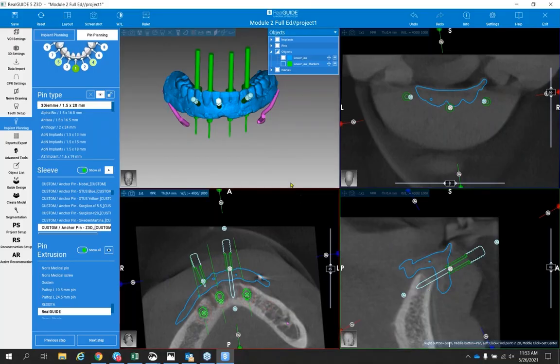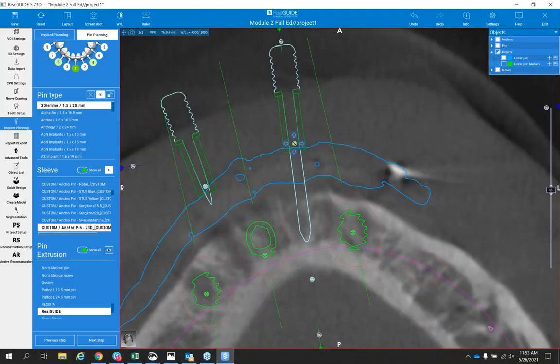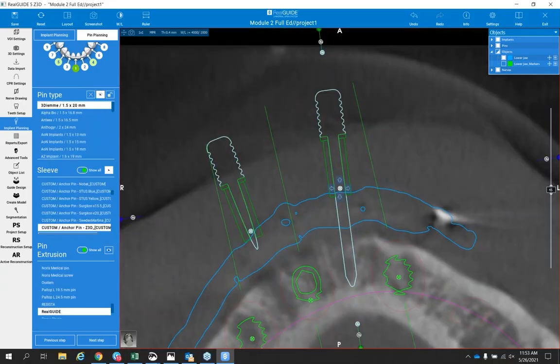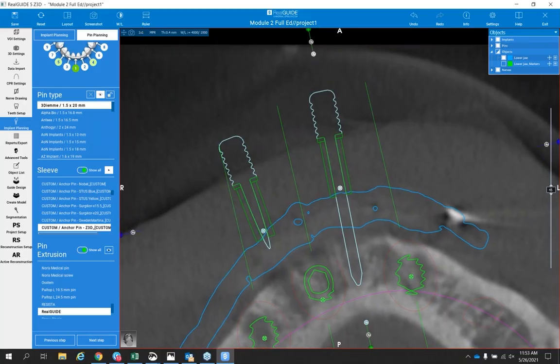I've got it high enough, I feel like. There may not be a frenum attachment. If there is, no worries. We can just slide it over. Let's make this larger. See if I've got room to slide this in a particular fashion. So yeah, I could probably bring it over. Click on it. Probably bring it over. I think I'm going to keep going this direction and maybe just cant a little bit this way.